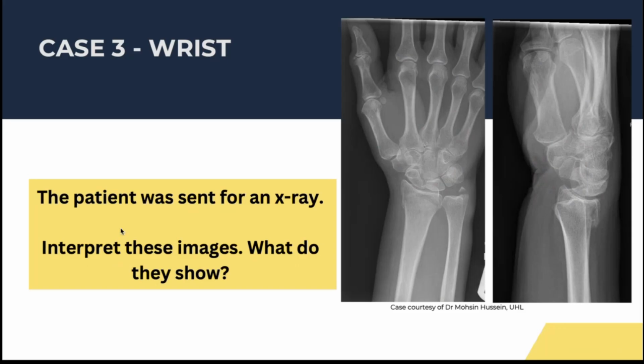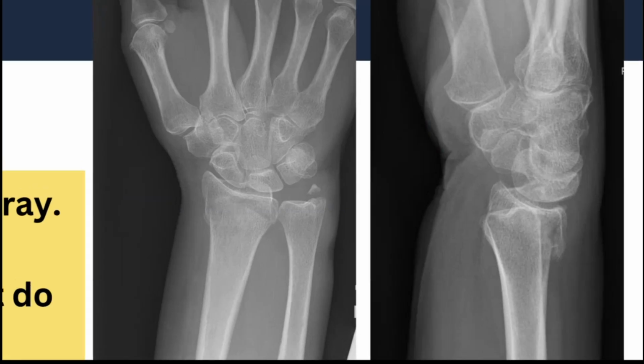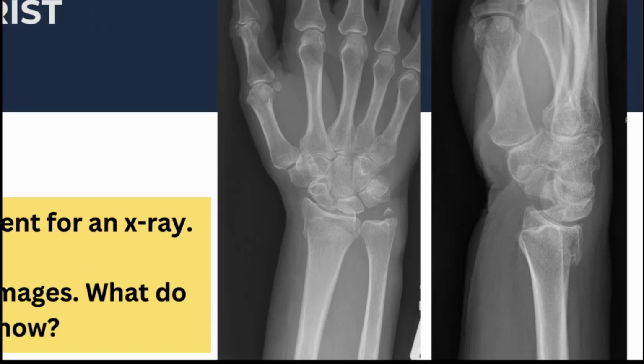So she was sent for an X-ray. Can we have a look at these images? What do they show if you were to interpret these images? I'll zoom in a wee bit for you as well, so you can see them a bit closer. You can either put them in the chat or you can pop your mic on and let us know. I'll give you a minute. I feel like I need a countdown clock.